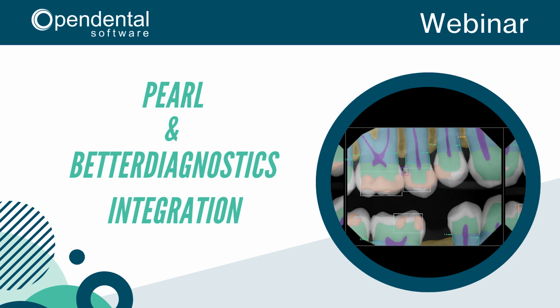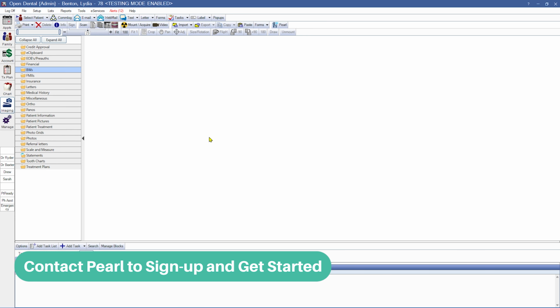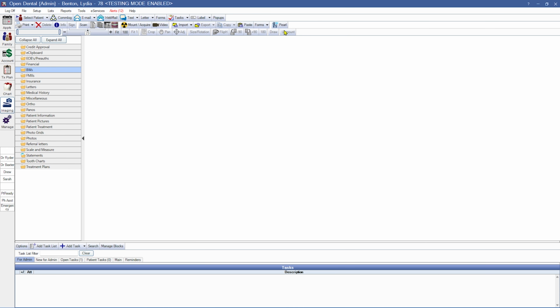Welcome to the demo of Open Dental's integrations in the imaging module for both Pearl and BetterDiagnostic. Start by enabling the Pearl feature. You'll want to make sure that the Pearl button is located in the imaging module. The button will be located in the top right-hand corner of the imaging module.